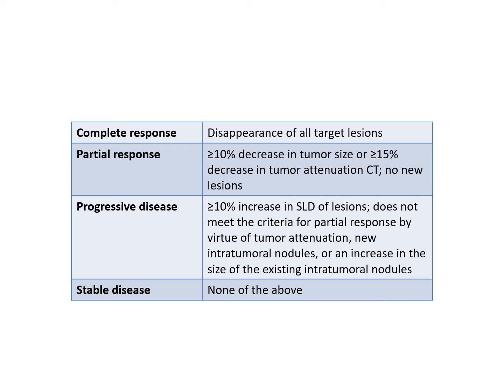So again, this is just a bit of detail here, but the point is that you look at the size as well as the actual attenuation. Okay, so you need to take both issues into consideration.